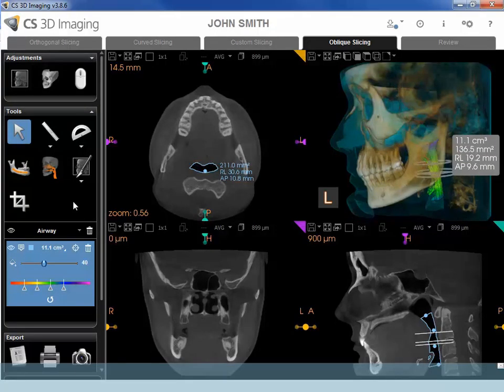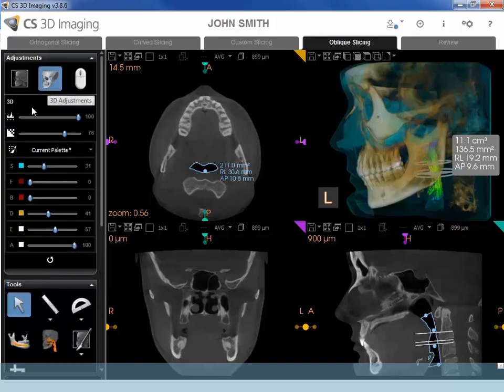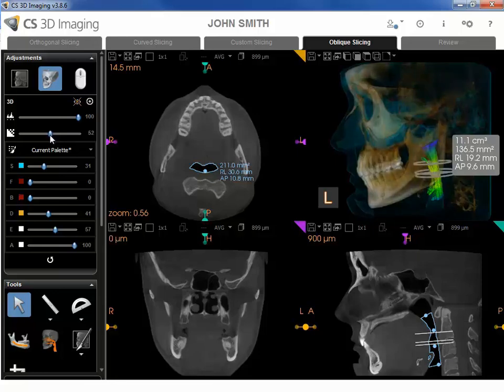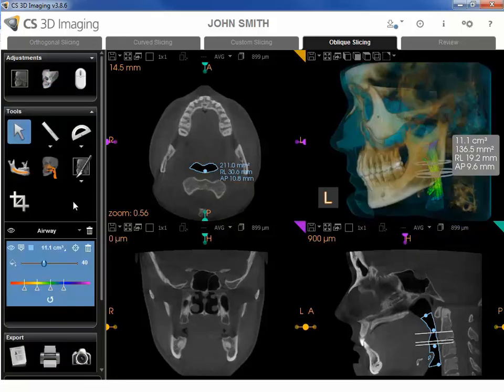The segmented airway and measurements are displayed. For an optimal view of the segmented airway, decrease the opacity level in the 3D scene. This enables you to better see the circles that indicate minimum measurements and the segmented areas. Colors shown are associated with the minimum measured areas.